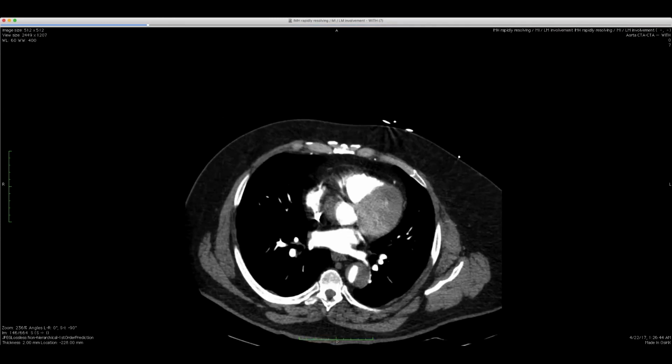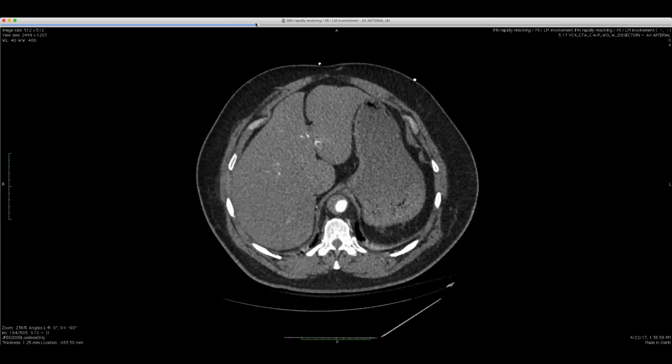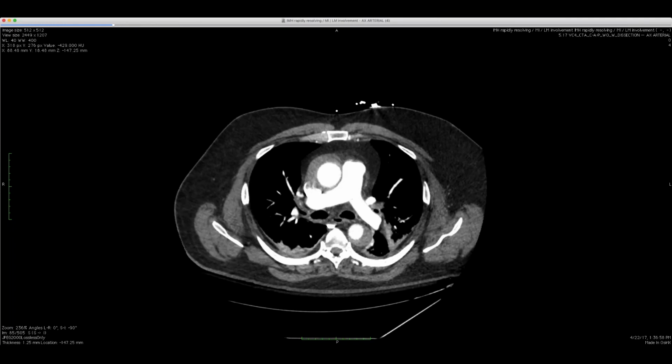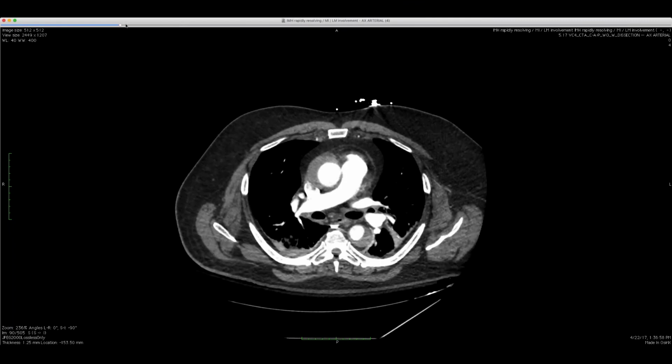And I'll show you, that was at about 1 a.m. I'll show you the same day, this is really very odd. About 12 hours later, the patient was rescanned, and this is what we have now. So you can see that the, let's just call it intramural hematoma for now, has much decreased by perhaps a centimeter there.